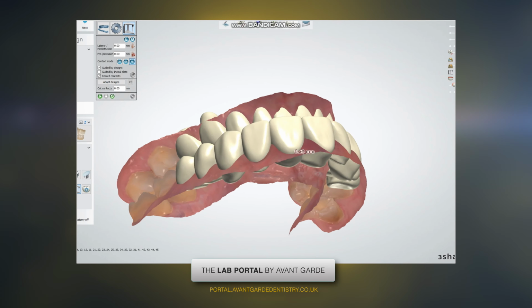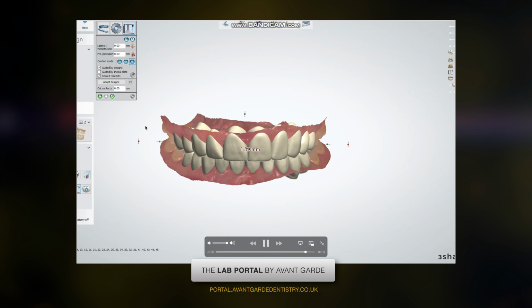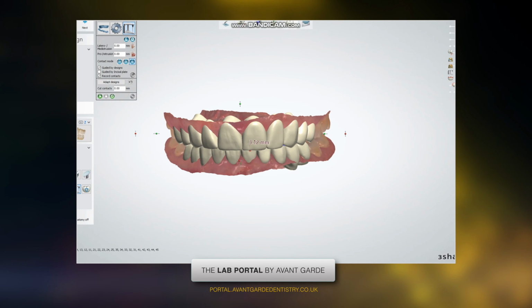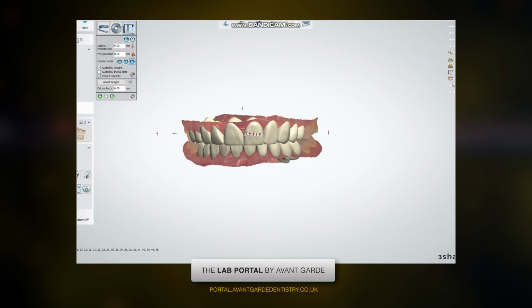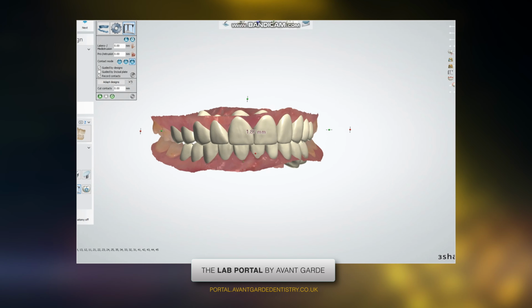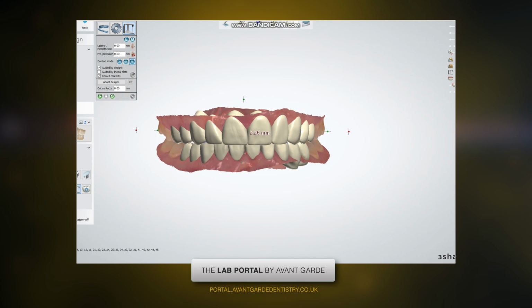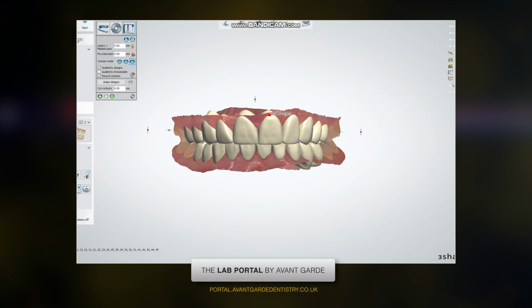Yeah. One final occlusal check. Yeah, so this is the final design for the mock-up. So we will need you to try this in the mouth, and then we will be able to see if the patient is happy with it and if he agrees for a final design, which will include the gum contouring. Thank you.